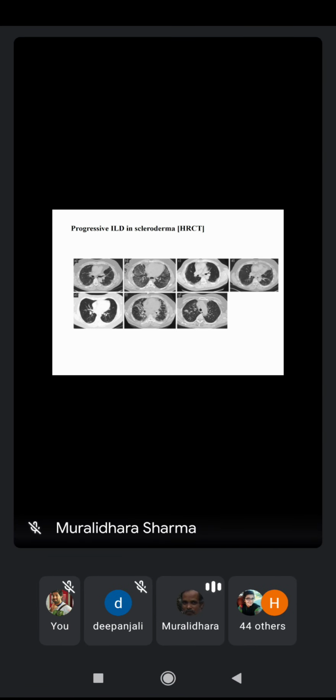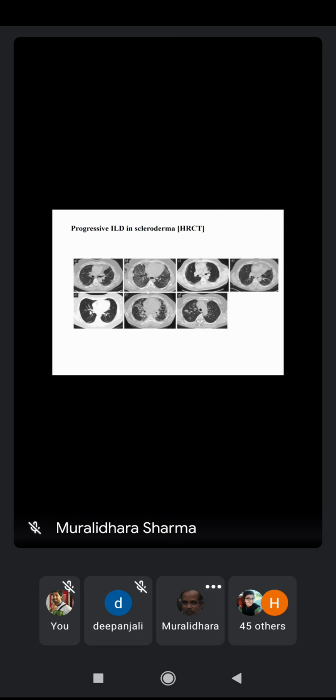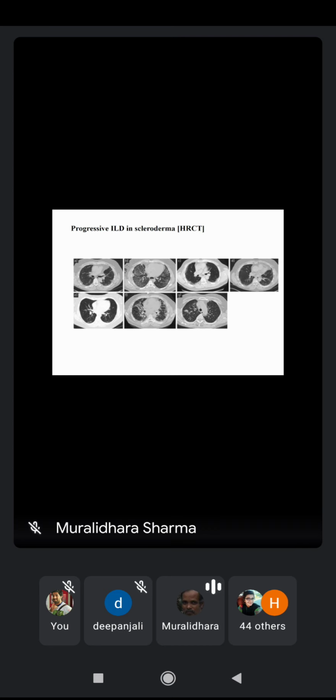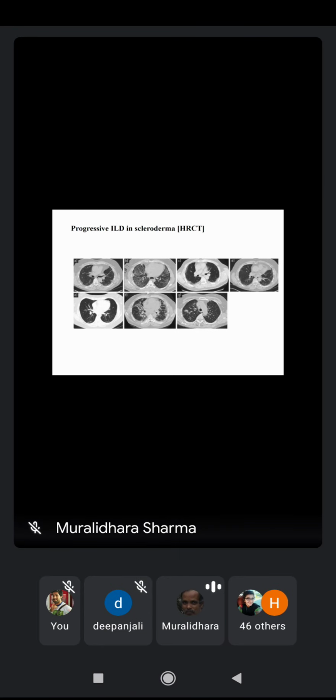This is another example of the same HRCT of two patients, another two sets of patients. These two are again another set of patients. Early stage and later advanced stage. A CT image at this advanced stage, moderate CT images. Now comparatively, the plain X-ray image might not show you the same intensity. So the severity of this interstitial lung disorder can be better assessed by HRCT, high resolution CT as such. Of course, the clinical features should be very characteristic. Clinical features should be of reduced exercise tolerance.